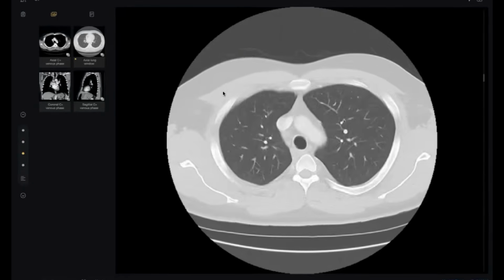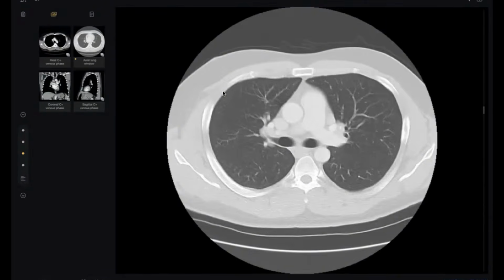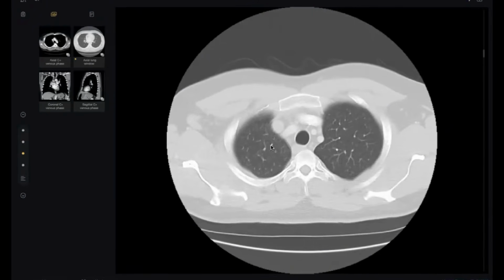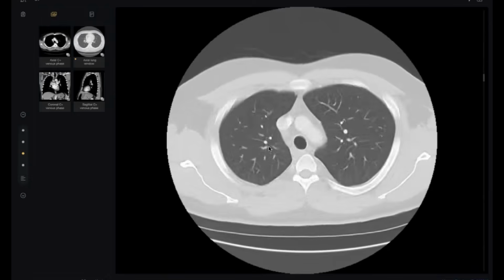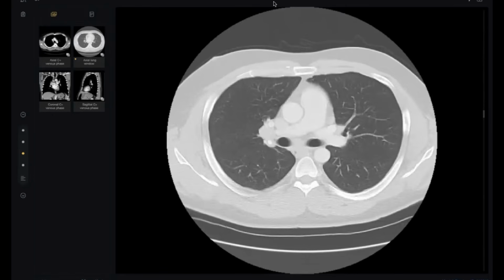Completely normal lung parenchyma is not acceptable in TB. Not acceptable because TB starts with at least a Ghon focus, any small calcific focus here. Anyway, if you put TB as a less likely differential diagnosis, okay, but don't put it before the call.